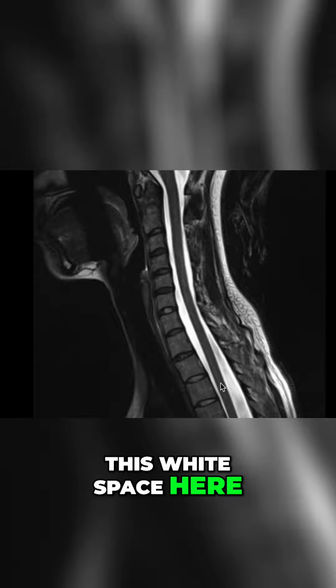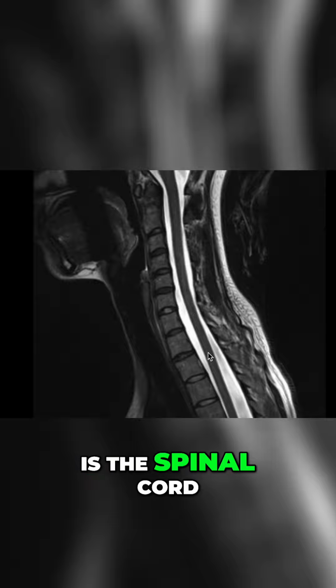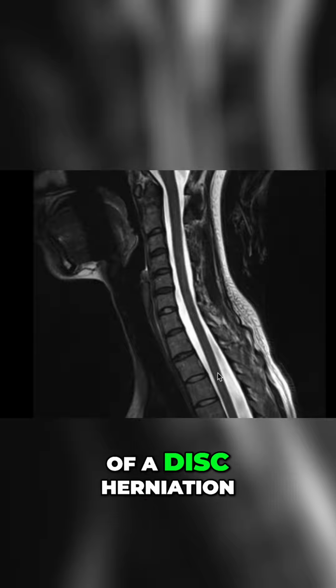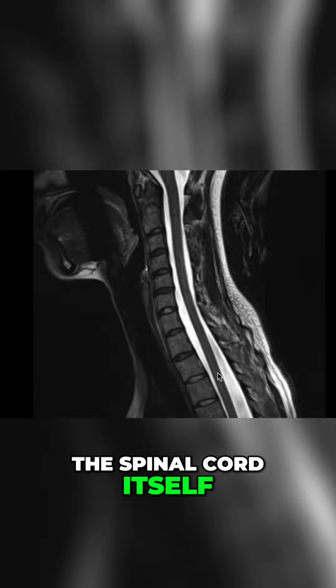Now this white space here defines the spinal canal, and I think of it as like an elevator shaft. Down the center here is the spinal cord. Now, in general, I'm looking for evidence of a disc herniation, some sort of impingement of a neural structure like a nerve root or the spinal cord itself.